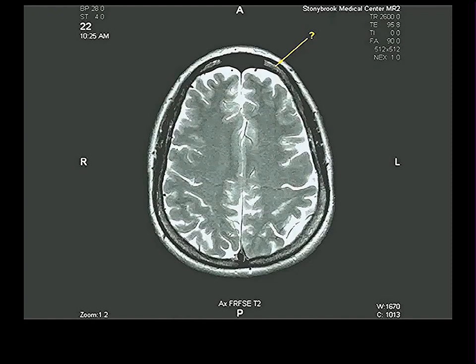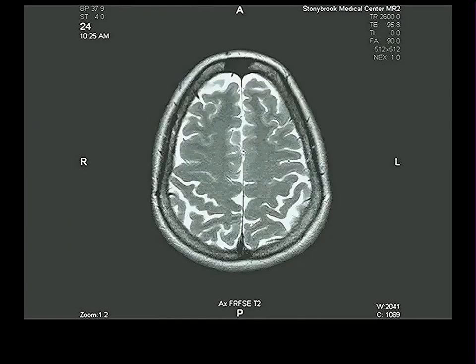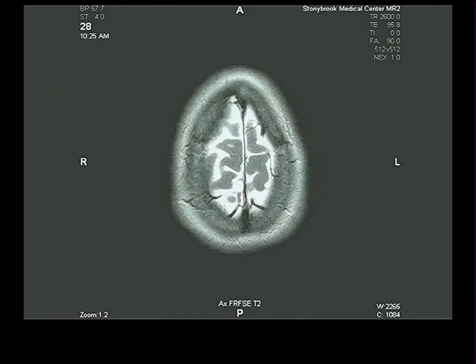Black, that's bone. Black is bone. When I used to lecture second years, after having all these series of lectures, I'd put up an MRI of a knee, and I'd point to a big black thing, and I'd get all sorts of answers. It cannot be that hard to remember that in an MR, bone is black. All right? There's the outer table of bone here. There's the inner table of bone there. That's the diploe that we're seeing with a little fat in it, probably. Coming up, up, up, and the end of the top of the skull.